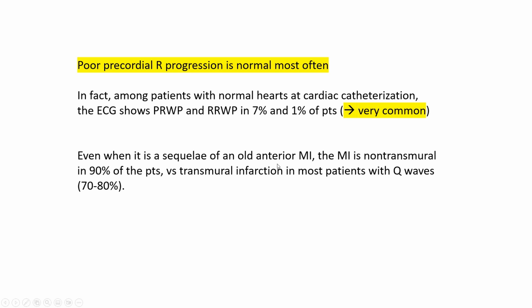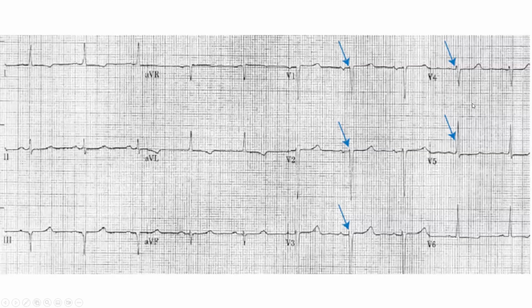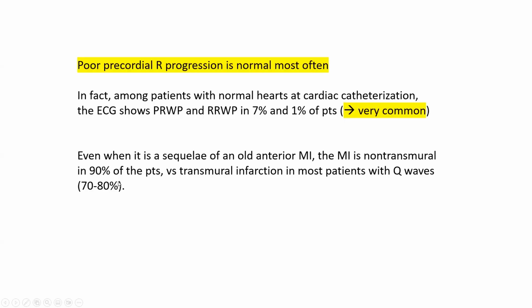Even when it's a sequela of an old anterior MI, the MI is usually non-transmural, versus it is transmural if you have a full-blown QS all the way in those leads.